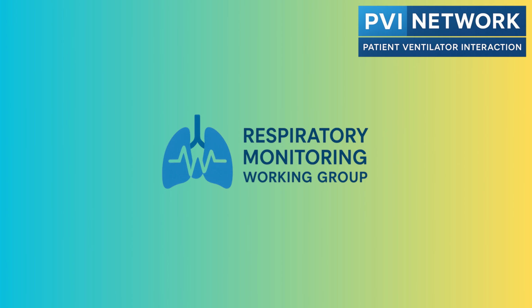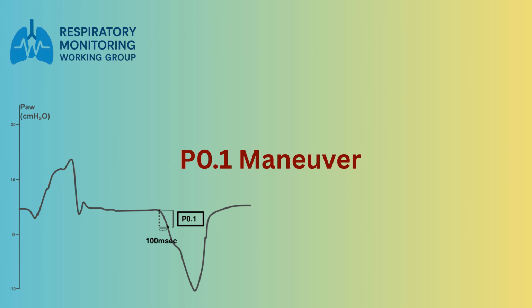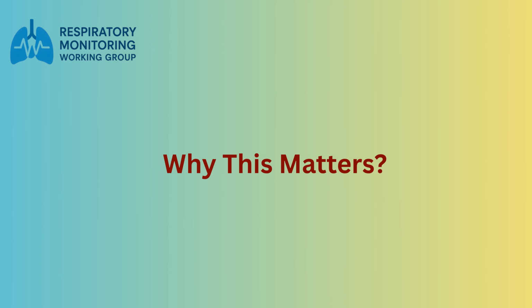In this video, we will explore the P0.1 maneuver, a simple bedside signal that helps you screen for low versus high respiratory drive during invasive mechanical ventilation. Why measurement of P0.1 is important.